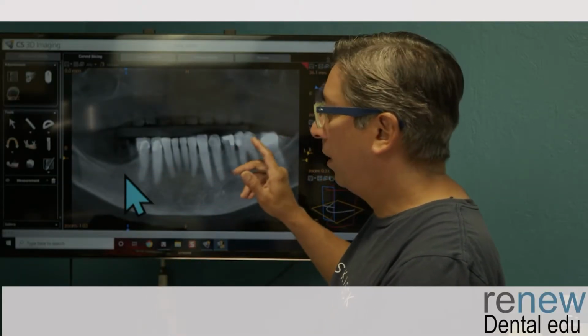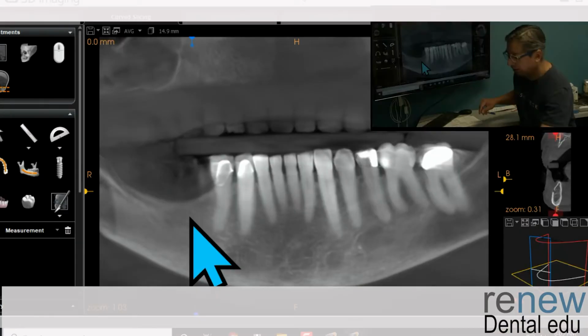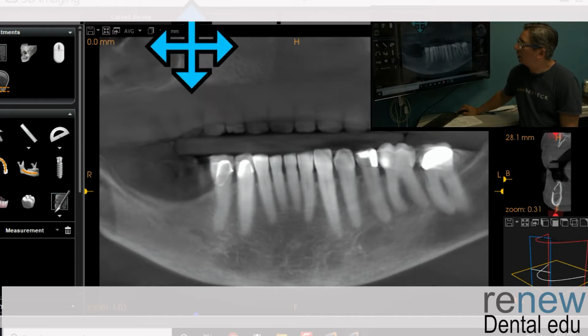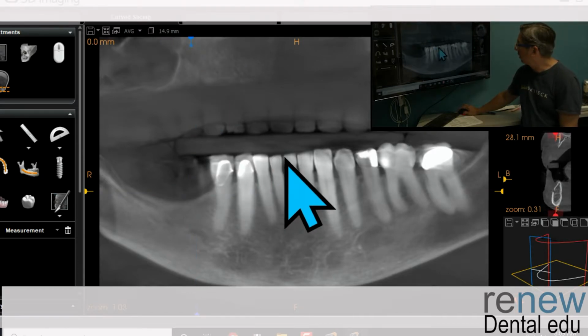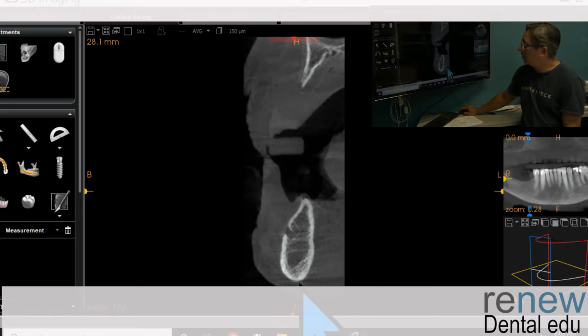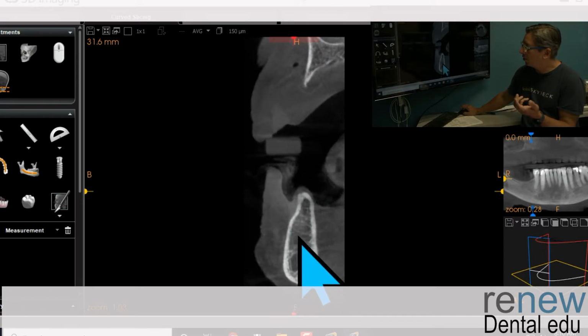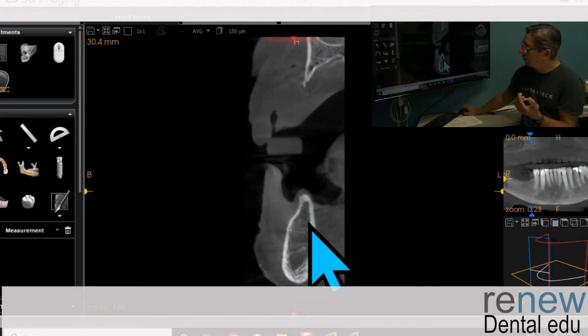So let's see now on the CT, what do we actually look at here? Let's look at 29. That would be about where it needs to be. And you can see it's just now like a little knife edge. And here's a foramen here. And you've got this kind of steel woolly, very lightly steel woolly look around that bone. So the bone characteristics aren't very good here at all. And the nerve is right here. And as much as that might be going up, it's still not very wide.